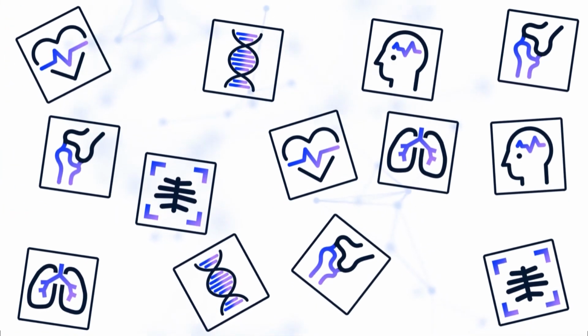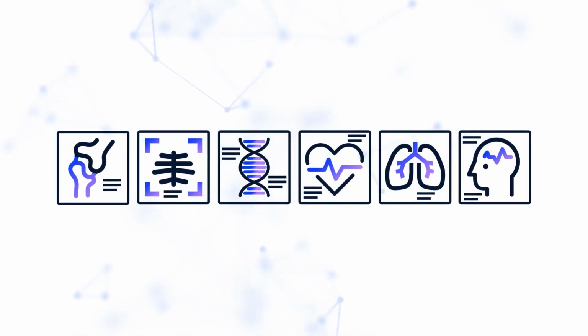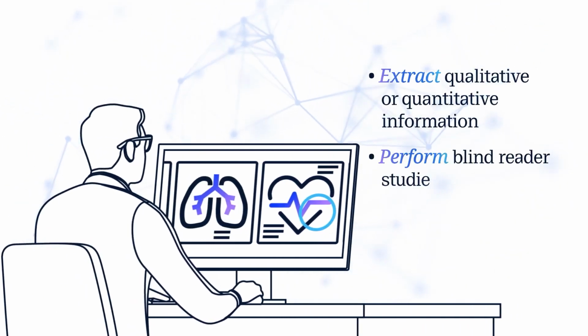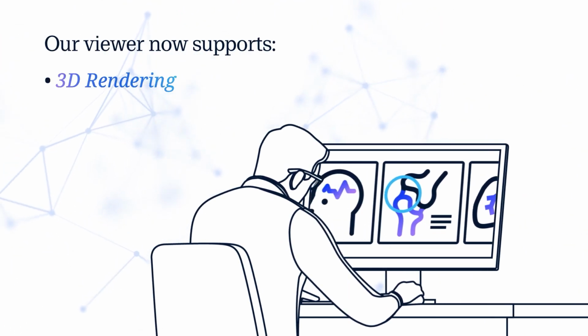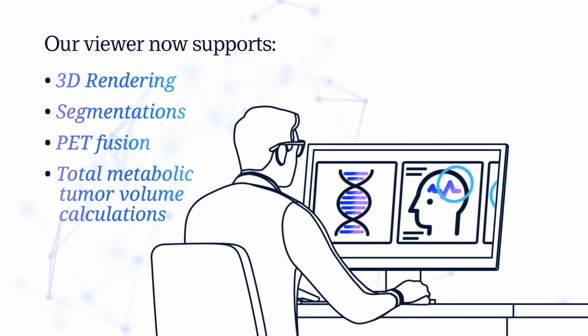Flywheel's platform enables users to efficiently organize, label, and annotate imaging data. Through a built-in radiology-grade viewer, users can extract qualitative or quantitative information, perform blind reader studies, and standardize workflows with custom labels and forms. Our viewer now supports 3D rendering, segmentations, PET fusion, and total metabolic tumor volume calculations to support oncology research.